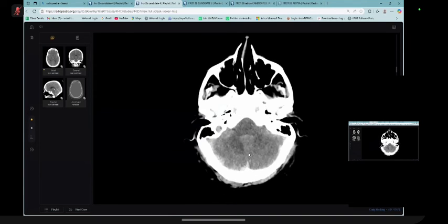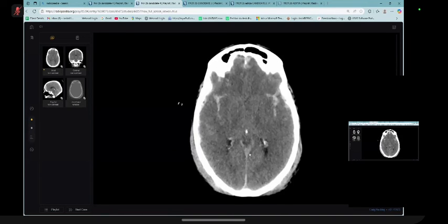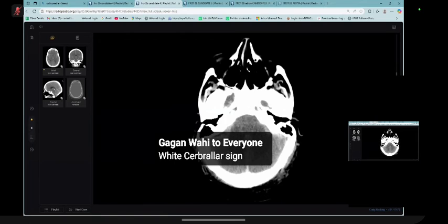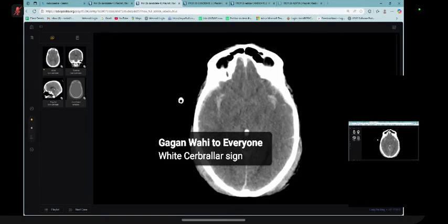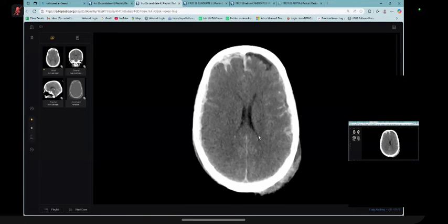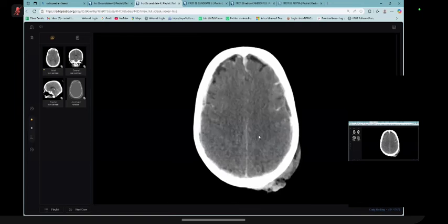Sir, there is a white cerebellar sign, a diffuse hypodensity of the brain. Sir, hypoxic ischemic insult, like a global bilateral cerebral hypoxic ischemic encephalopathy with white cerebellar sign.